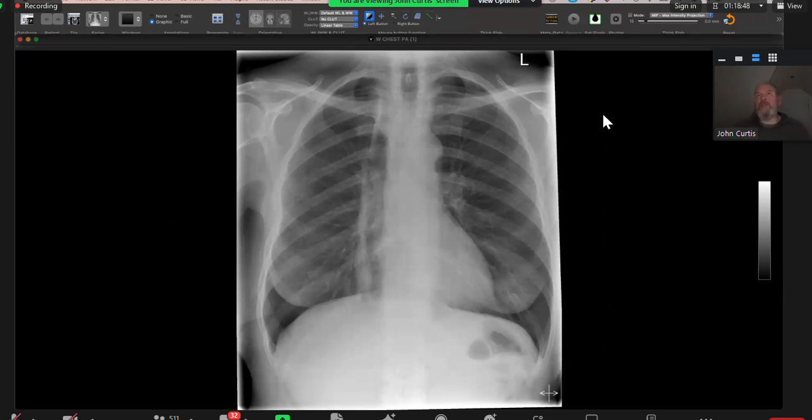Okay, this patient is complaining of dysphagia. I'm presented with a chest radiograph of an adult patient. The most striking abnormality is a linear density, which seems to be demarcating what looks to be a dilated esophagus. Just pointing out with my mouse in this particular region is what I'm looking at.